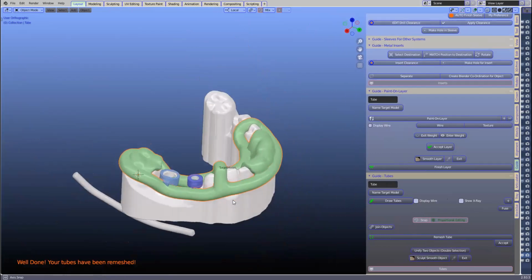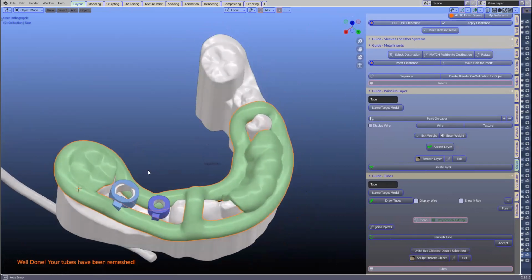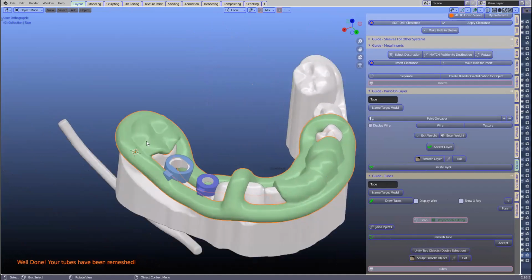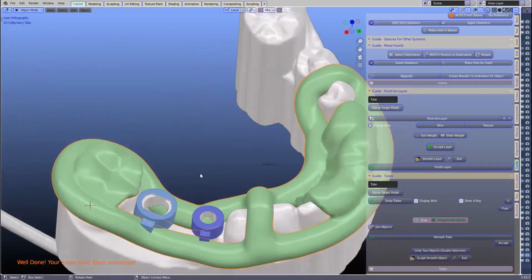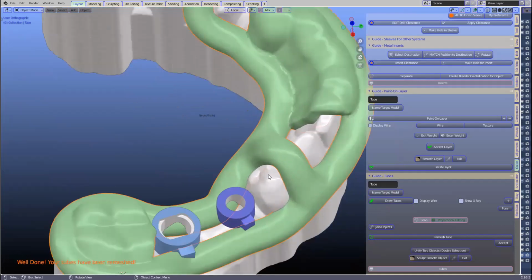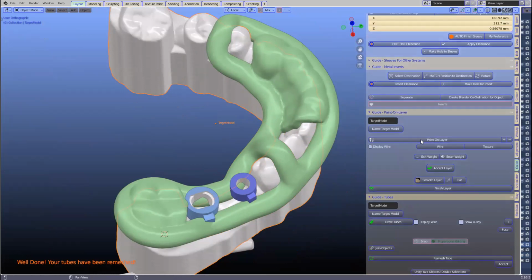All right, so there's basically just one step left, and that's to cut the inside surfaces. Okay, I should have actually overlapped a bit. Yeah, I was thinking the same, because you want to demonstrate the way the cutting tool works, that it can clear way for the drill. Yeah, so what I'll do is I'll just paint a section over there on purpose. Just cover it, yeah. Just on purpose. So paint layer.